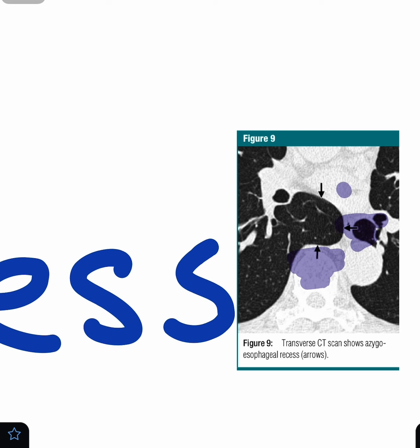This area is important as on a chest X-ray you are not going to see any lesion if it is there. It is not going to be displayed on a chest X-ray, so you might miss this area if the lesion is here. And this area can be distorted because of subcarinal lymphadenopathy or adjacent lymphadenopathy.